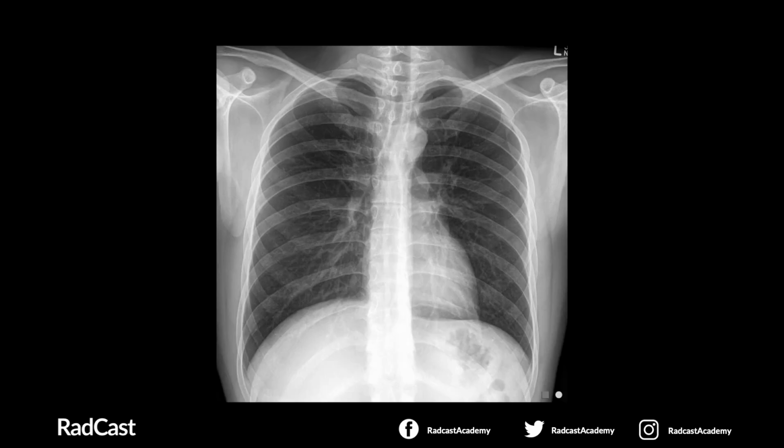Finally, let's come back to our normal chest X-ray. We can immediately see here that there are no tubes, lines, valves, or pacemakers, or any other foreign bodies. If we haven't assessed the mediastinum by this point, now is the time. We can look at the aortic knuckle and the aortopulmonary window to check for signs of aneurysm or malignancy. We can look at the bones, for example, the clavicles, the scapulae, the anterior and posterior ribs, and even the spine. We can look for fractures, dislocations, or any signs of lytic lesions. And finally, we would then assess the soft tissue to look for signs of any hematoma or any evidence of surgical emphysema.